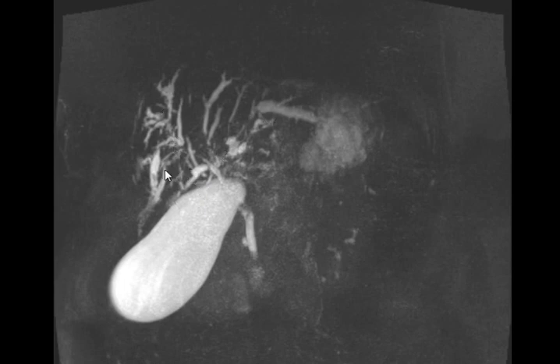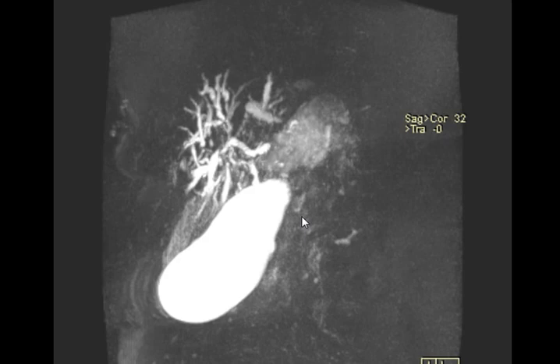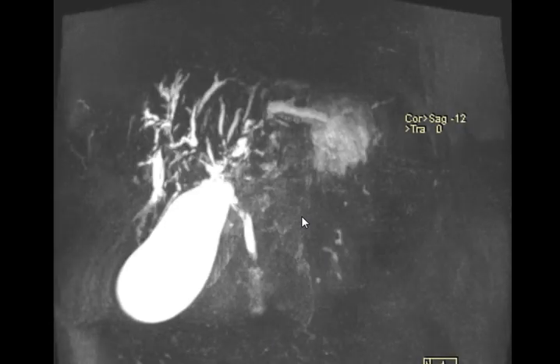Intrahepatic biliary duct dilatation, with somewhat nodular. What is nodular? Nodular, beaded, in strictures. Beaded? Okay. Let me help you with something. We have this MIP rotational image. Just rotate it, maybe it can help you in figuring it out.